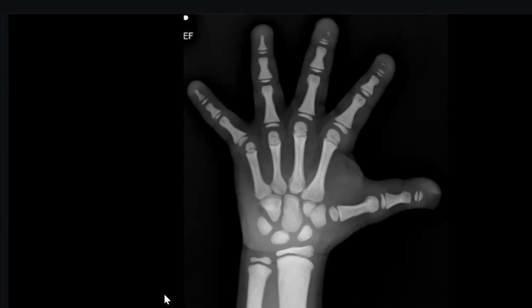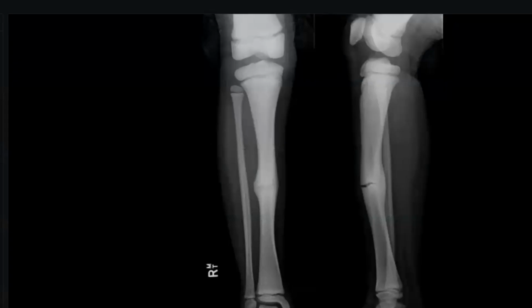The acro-osteolysis pattern is more central, and there is quite dense sclerosis with obliteration of cortex and medullary differentiation. I would like to give a skeletal survey for all of the other bones as well. Based on this hand X-ray alone, my imaging findings are suggestive.